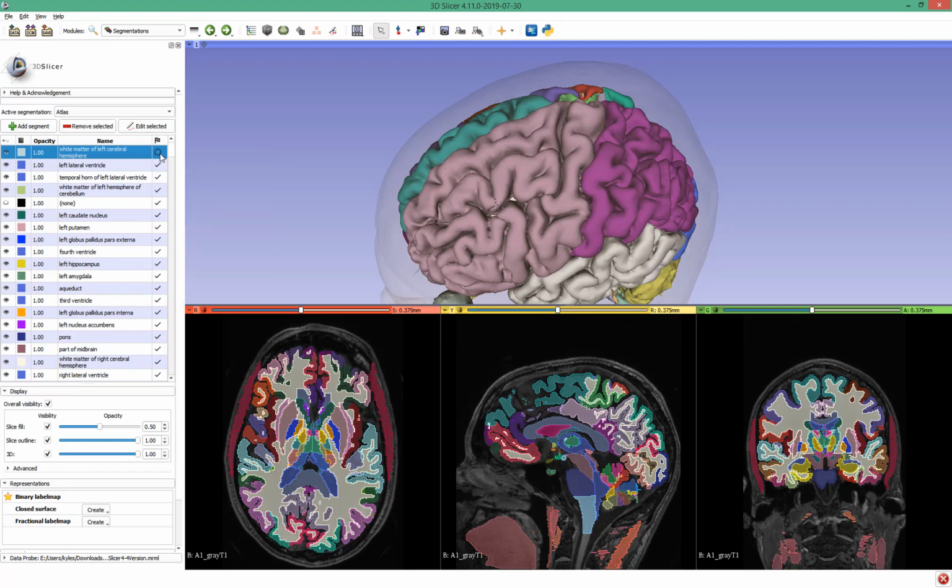From not started, you can move to the next status, in progress, by left clicking on the icon, and then again to completed, and then clicking again will take you to flagged. Once you're in flagged and completed, you can only ever go between those 2 states by left clicking, but by right clicking on the table, you can change the segment to any state that you want.